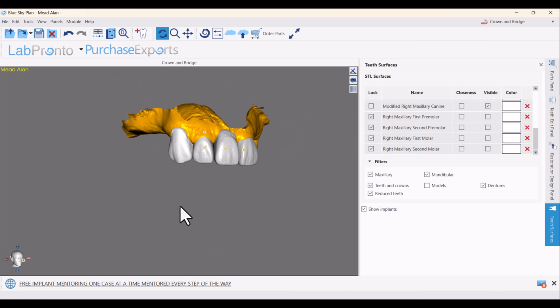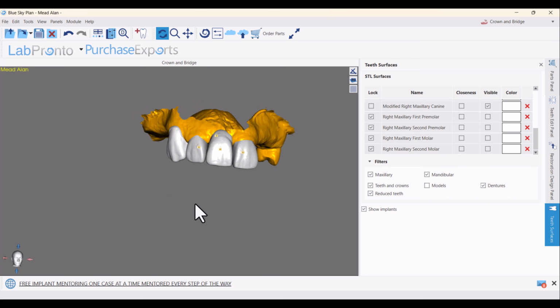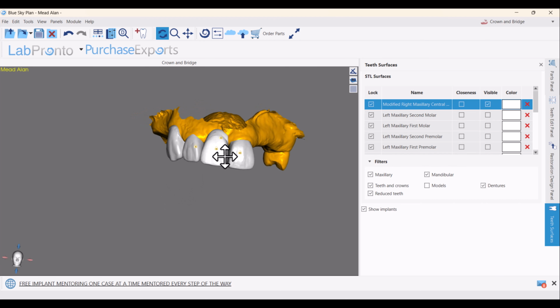Now, the one nice thing with this program is I can send this all to Alan, and he can modify it himself pretty easily if you wanted to. Well, this is bothering me right now. Bring it down slightly here.